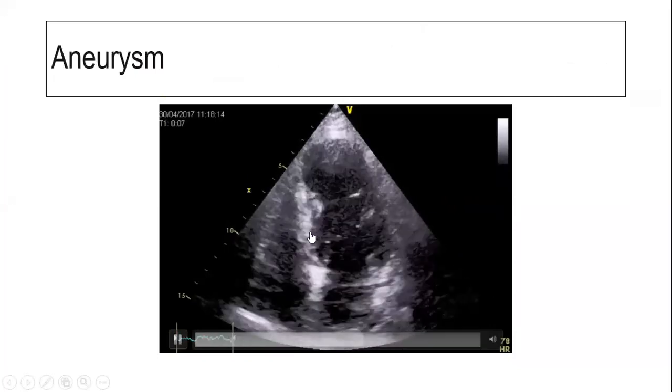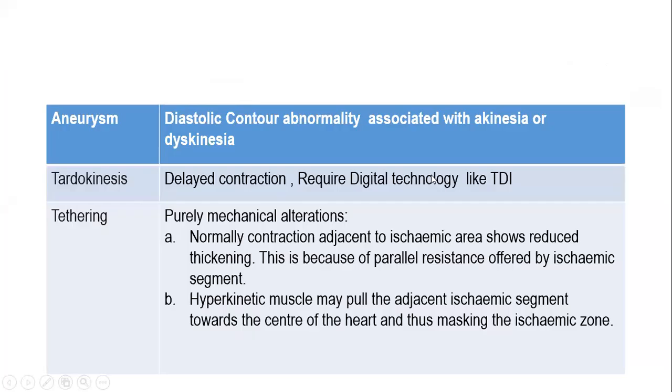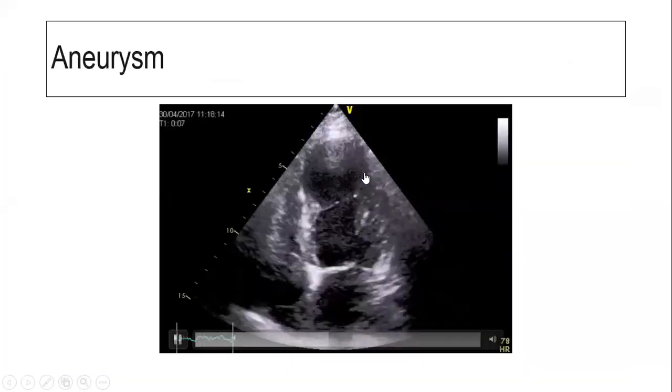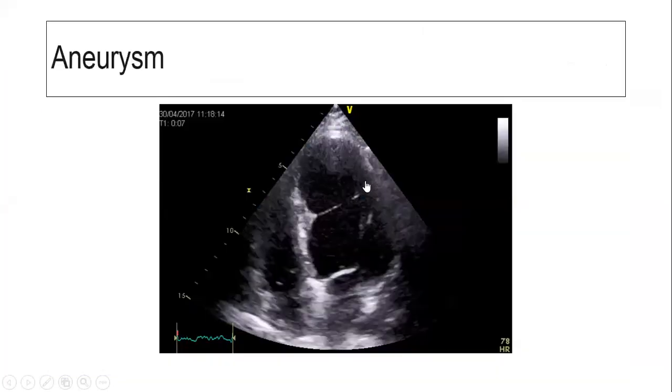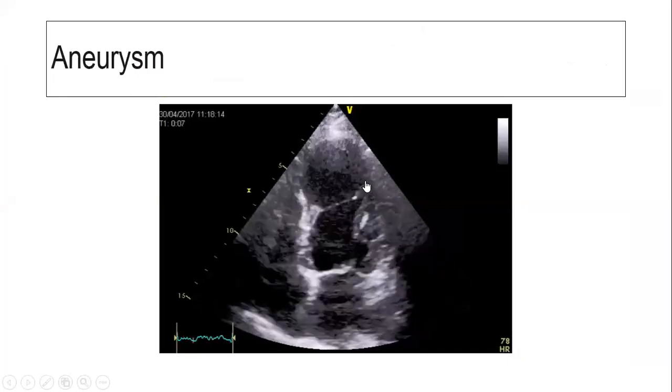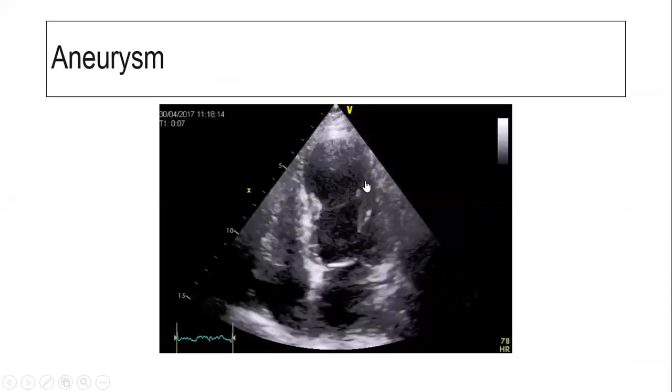Till this point, there's some contraction present, both in septum as well as lateral part. But if you look at the apical part of this image, this is almost thinned out and it has become aneurysmal. This is what is burnt out phase, where we cannot do anything for this subset of patients.